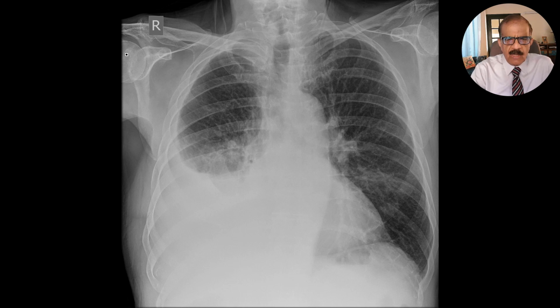All right. So this is the chest X-ray, and I understand you have attended my first module on X-ray, which was on the normal X-ray. So I understand you all know what the abnormality is here. My teaching is that once you read the X-ray to yourself, you don't have to read it out loud, you go through everything, making sure that everything is okay, and then come to the abnormality, which may be very obvious or subtle, and then describe that opacity.